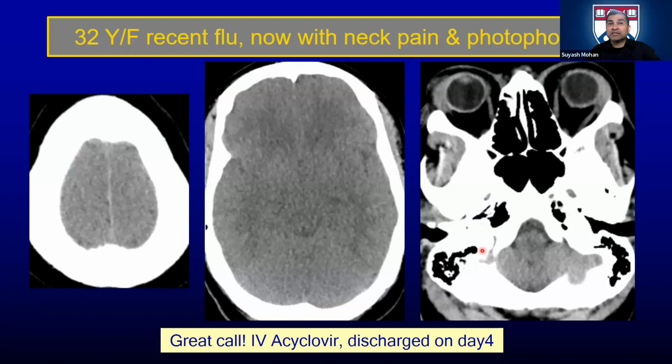So, when I teach our trainees and residents, one thing I say is that no matter how young the patient is, you go to the very top of the brain on the axial section, and you should be able to see 3 sulci on each side. I call this the 3 sulcus sign. Michael was with me yesterday, and I was telling him these things are not described in textbooks. These are life lessons. If you don't see 3 sulci at the vertex, then no matter how normal that scan looks, you cannot let that go. This patient has diffuse brain swelling, diffuse cerebral edema.